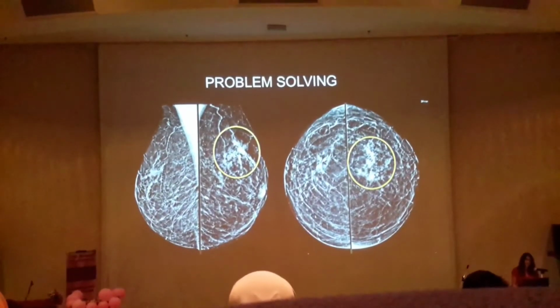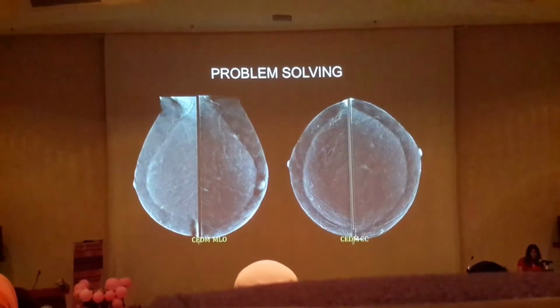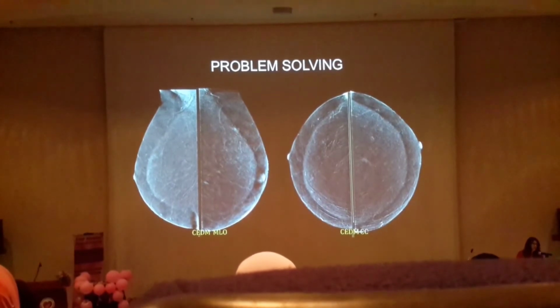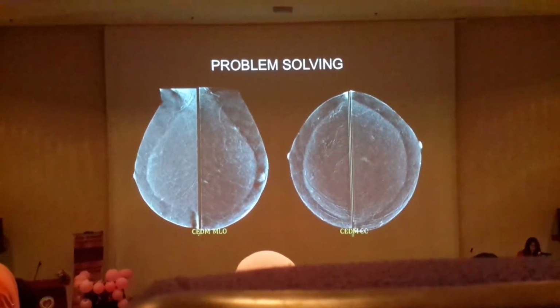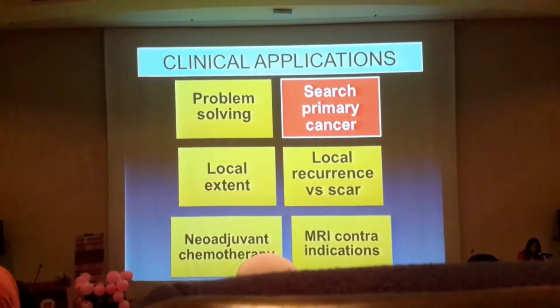There'll be another radiologist and they'll just keep doing that 6 months thing, which is an added radiation dose to the patient. But we did a contrasted mammogram, and we could tell her, you don't have to come every 6 months, just come back after 2 years for your normal regular follow-up. So this is no malignancy and an asymmetric density.